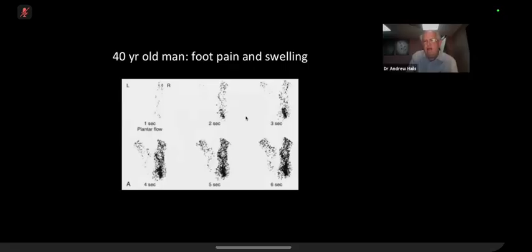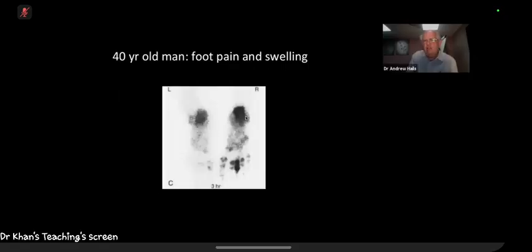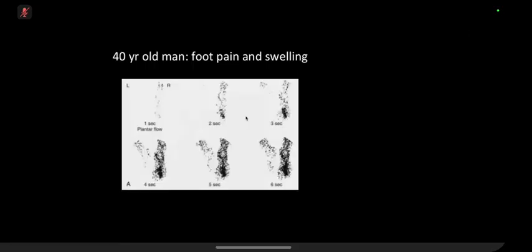Right, okay. And what kind of problem might this person have? It will be due to hyperemia, so the patient may have a focal infection or osteomyelitis, which is causing an increased amount of blood going to that area, and therefore causing the increased uptake on that side.